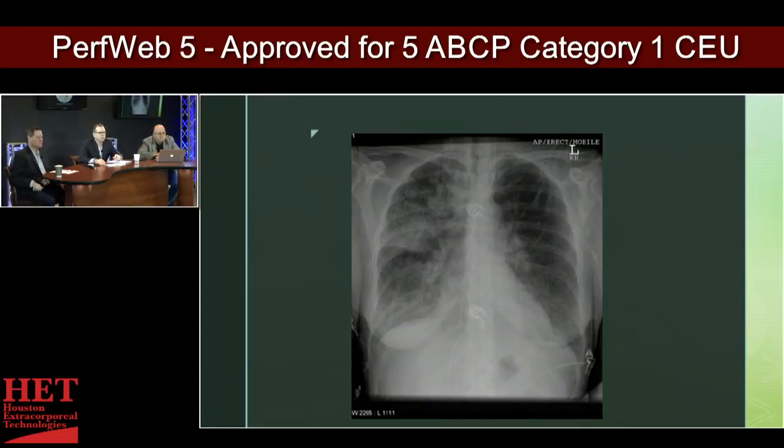This one's a little bit different. Some of the same processes we've described, but presented in a different way. And so I can tell you that the etiology of this process is going to be a little bit different. So again, Patrick, describe what you see in this film.